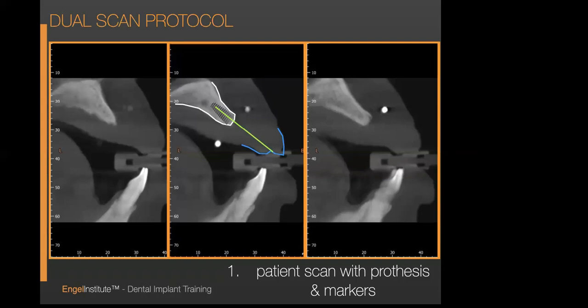Now, I'm going to go back again. What do you notice about this, or what do you not notice about this? I'm going to show you something. If this is the bone, and I'm hoping you can see my cursor, and this is the outside of the denture and the denture tooth, okay? Where's the separation? That's the whole point, there isn't one. So I'm going to show you how to look at separation. It's very, very easy to do.